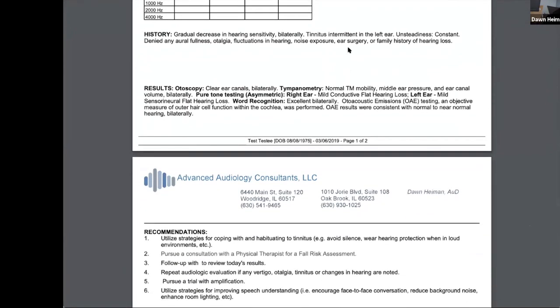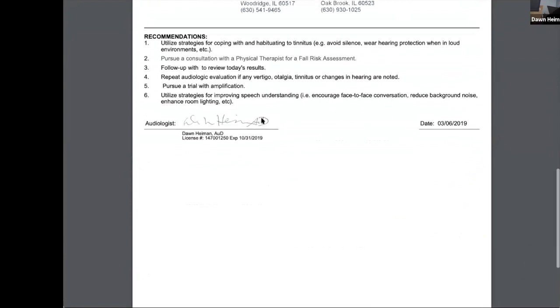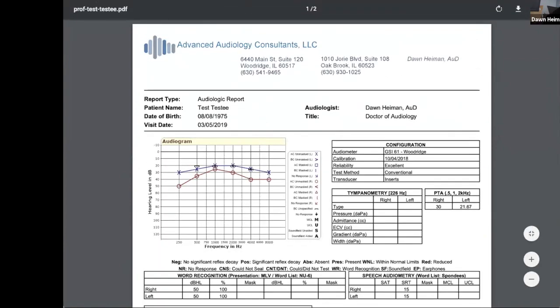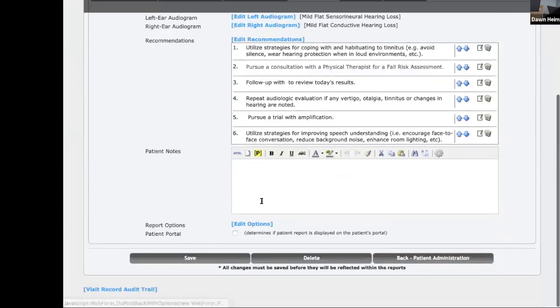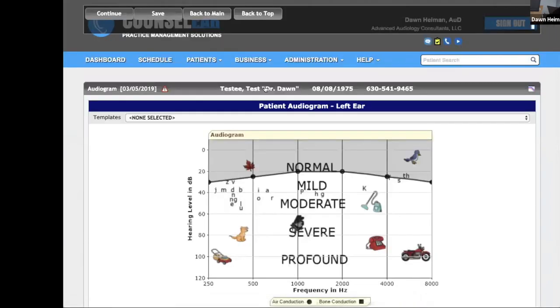There's a big space here because I deleted something. Normally it would come right back up here. Anyway, all your strategies are here, recommendations and things like that. And it opens it in a different screen so you can print it. I can go back and say, wait a minute, oops. I always check before I send.